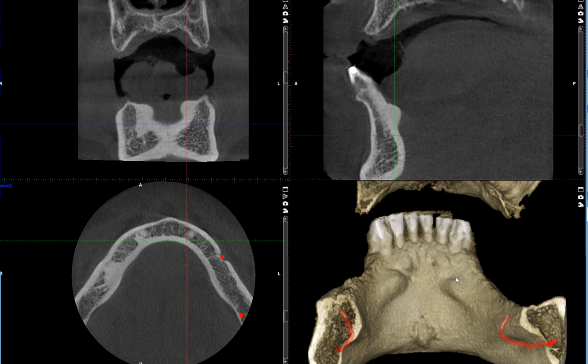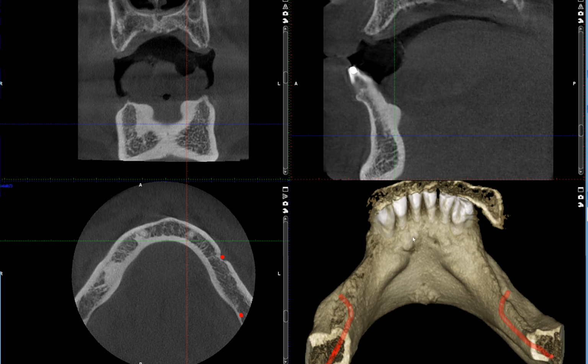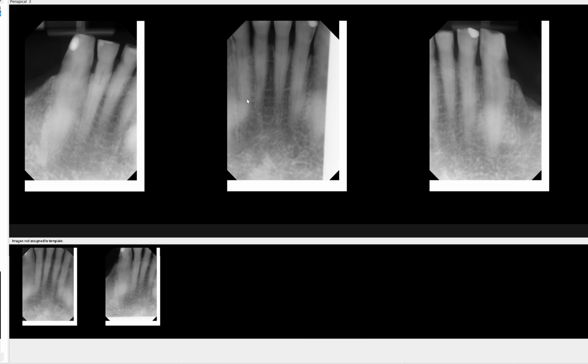So what are these? These are mandibular tori. And I think you'll have no problem diagnosing this clinically, but sometimes if you look at a periapical radiograph, the findings are rather subtle and may not show up very well on panoramic radiograph. But let's head back to our periapical radiograph and we can see them.